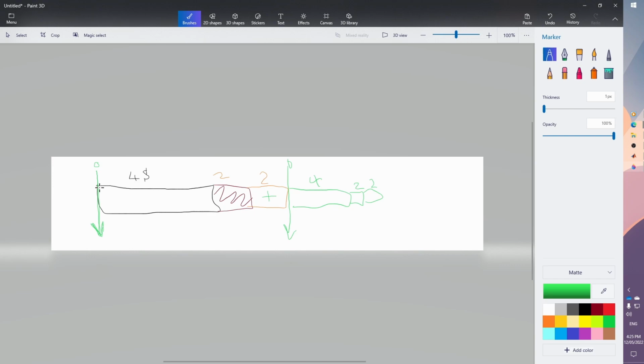So participants are doing the motor imagination for 4 seconds. We can imagine that if we have the onset, like a marker for the beginning of the trial, and we know which sample is time zero, we can just cut 4 seconds after this onset and analyze this part, and cut another 4 seconds after a different cue and analyze this part. So imagine that this is for the right hand and this is imagination for the left hand, and we are trying to see the differences between the two.